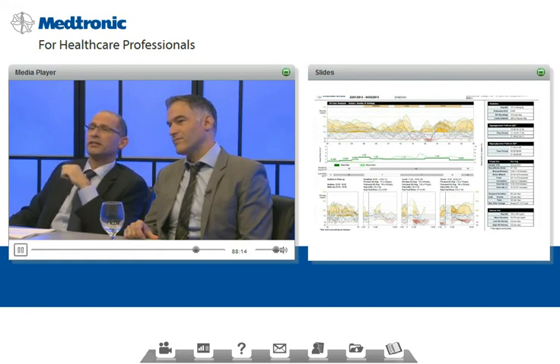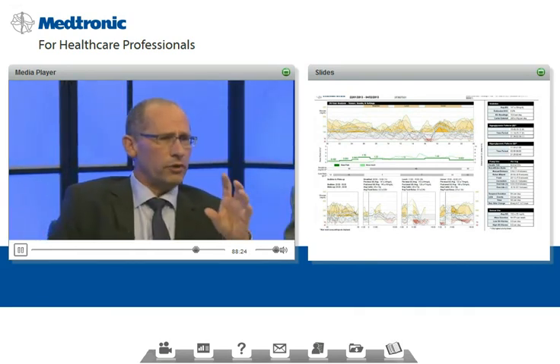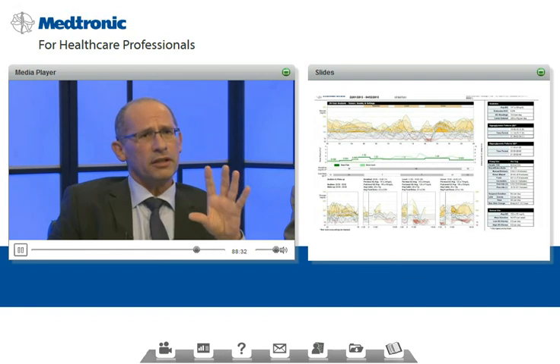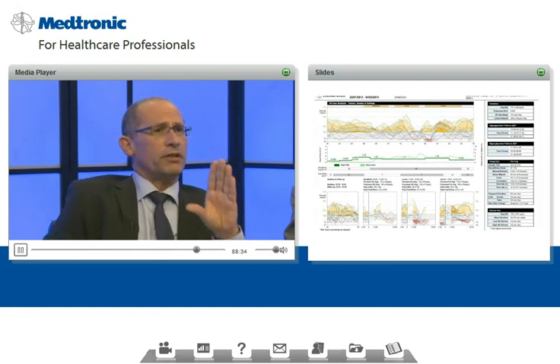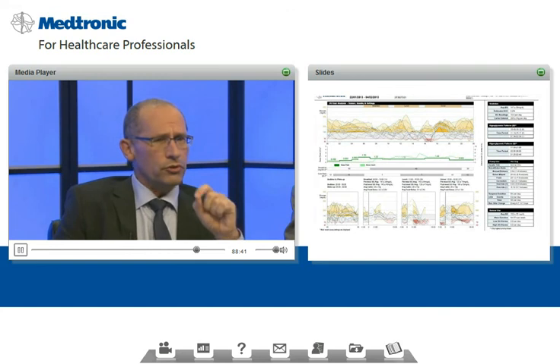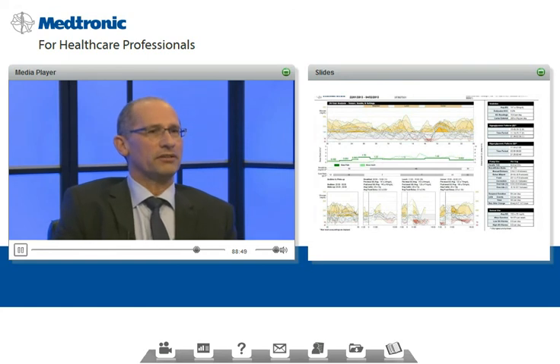The audience said that a lot of people thought that changing the insulin to carbohydrate ratio is the answer. I want you to look at this data again and decide. Let's try to fix the dinner and the lunch. Is changing the insulin to carbohydrate ratio the right approach to decrease the high excursions of these meals?